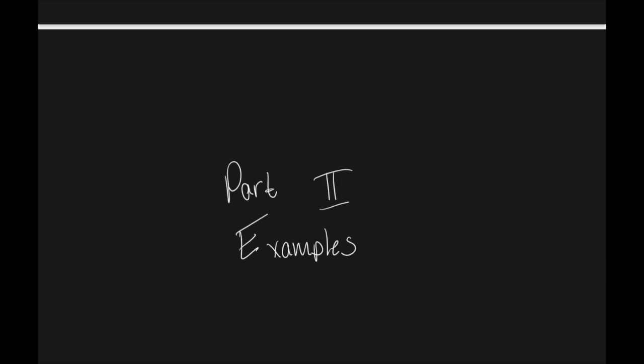So guys, that is a lot of stuff, a lot of things to keep in mind as we look at these 12 leads. It definitely takes practice, and I highly recommend looking at a lot of examples of EKGs to start to gain a familiarity with normal variance and when things don't look right. In the next section, we're going to do just that. We're going to look at 10 examples.